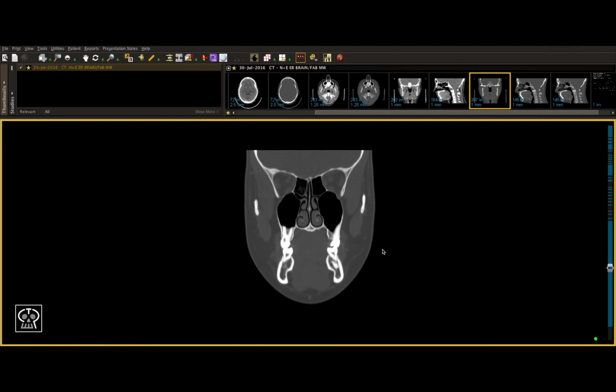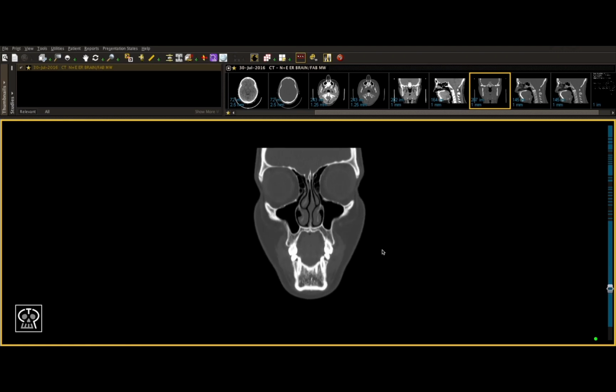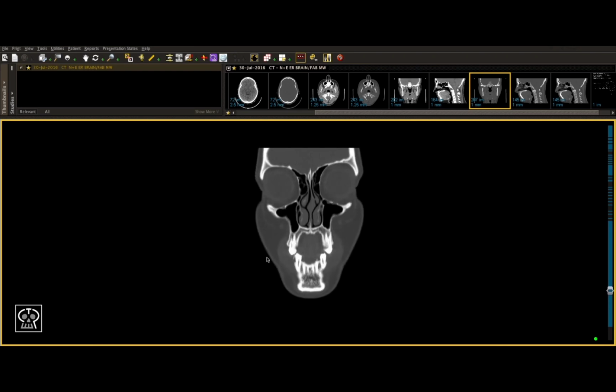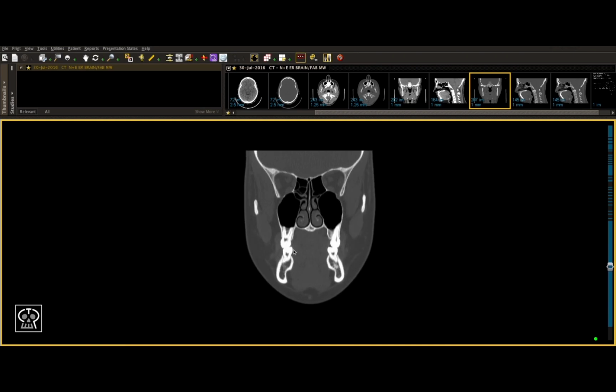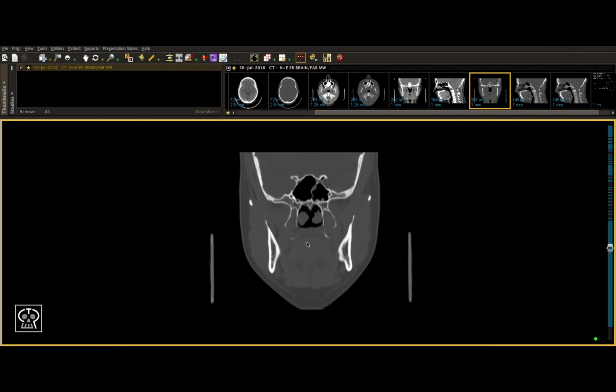It's also good to look at the sinuses from this perspective, as you can visualize any fractures you know about from a different view. Other than dentoalveolar fractures, and even dental fractures, the coronal view is great when it comes to the maxilla for one more point. Remember in the axial view how crucial it is to always look at your pterygoid plates. However, sometimes it can be very difficult to tell if there's a step off or a fracture in them because they are so thin. A great idea is to visualize them again in the coronal view.